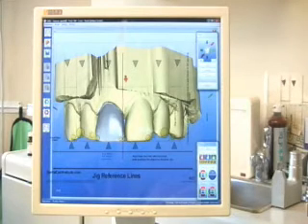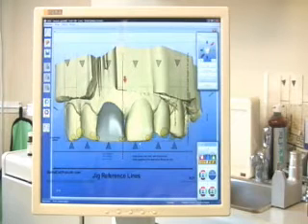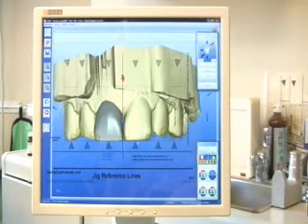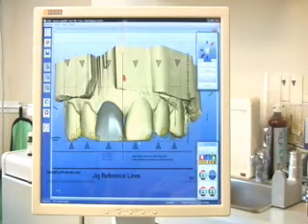Using the marks that we placed on the overlay when we designed the first restoration, we can get the overlay to be in a consistent position over the virtual model. We will now be able to evaluate the angulation of the restoration, the incisal line angles, the width, the length, and, ever important, evaluate both restorations to see if there is any midline cant.